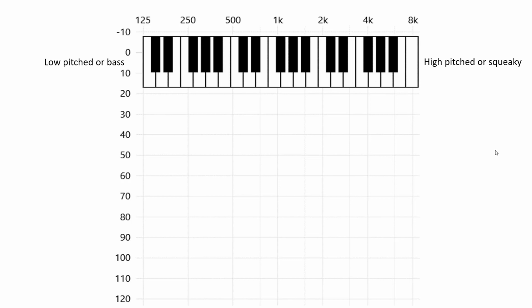Now we put those together, of course, and we can talk about how loud a sound is that someone can hear, and at what pitch do they hear that well or that poorly. Let's have a look at some example audiograms to better understand that concept.